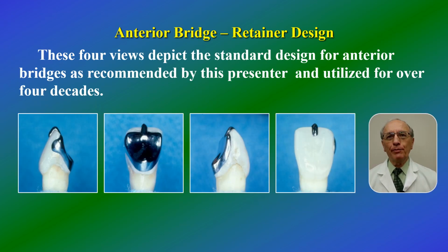These 4 views depict the standard design for anterior bridges as recommended by this presenter and utilized for over 4 decades. Avoiding gray discoloration of the incisal area will be described in another segment, by gold plating the etched metal surface.